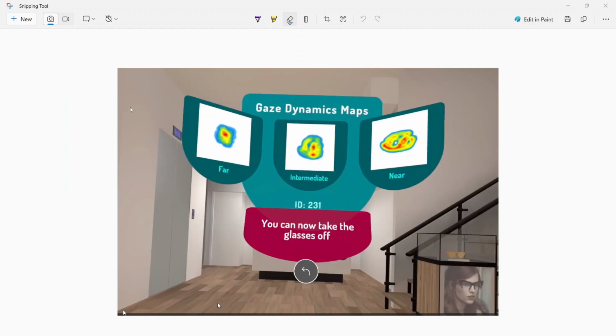This is video 2 of ordering Nova AI progressives using the information and algorithms pulled from our VR unit program to finally order the progressive on our Nova website. Very importantly, this is the final screen of the first video, and it's going to give us the information we need to take to the next website.